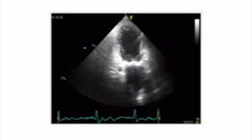So this is clearly a case of a right ventricular infarct, which is in combination with the RCA occlusion. So important information, poor right ventricular function in the setting of myocardial infarction, as we already learned in the previous chapters, is something that reduces the prognosis or causes a poor prognosis of the patient.